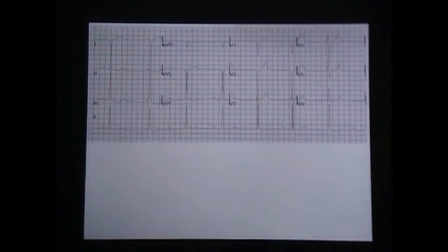Let's see. Obviously, I'm trying to look at the P waves. There are possibly more P waves than QRSs. Or it looks like I'm thinking third degree block based on just looking at it, but I don't know, jumping ahead. Well, and that's your first impression. You can obviously have your first impression, and then kind of go through it. That's hard to break down after. I kind of have my assumption, but I'm trying to describe what it is that I'm seeing.